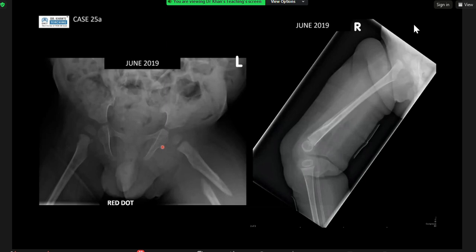Okay, next case. This is a difficult case. You can ask me questions, or I might give you hints. We've got a series of studies. It's a story case. Have a look at the first X-ray and tell me what you see. Just tell me what you see, but don't give me a differential first. Then I'll show you other images.